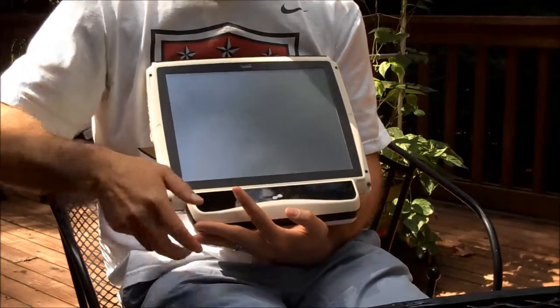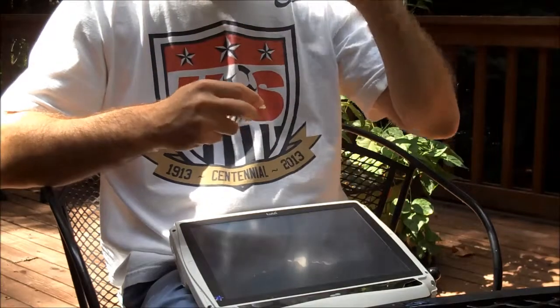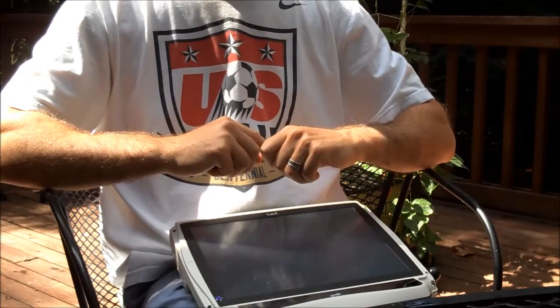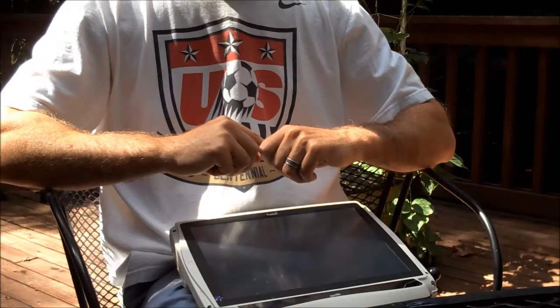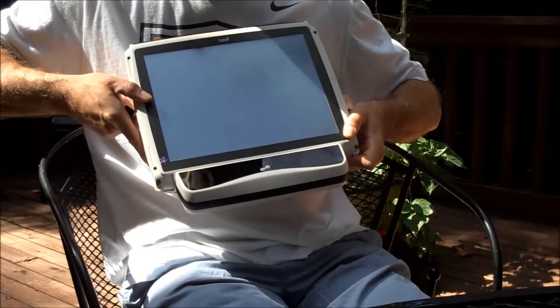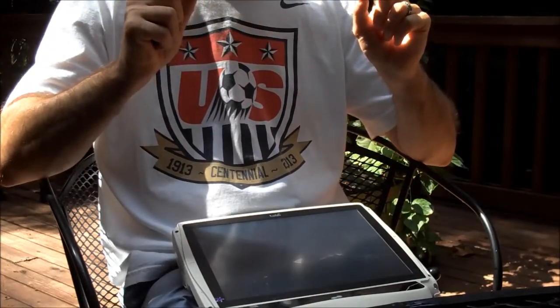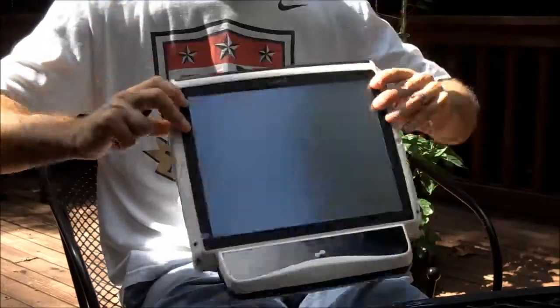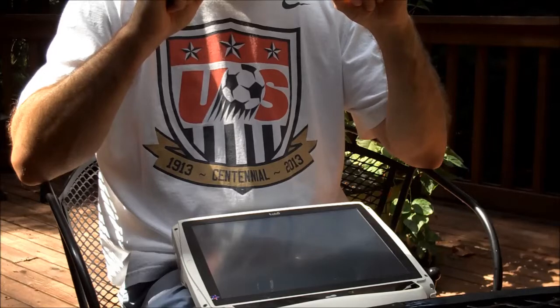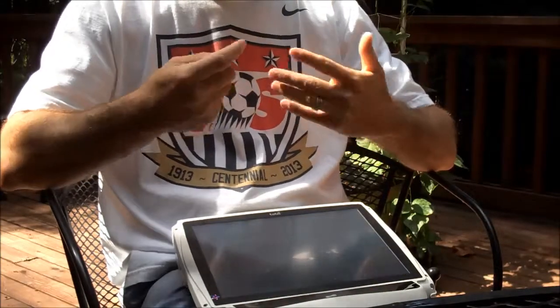SkyDrive and Dropbox, and there are other cloud storage services out there, are designed around being able to store files out in the cloud on the internet and access them from any machine. The nice thing I like about SkyDrive and Dropbox is they both have client applications for Windows that you can store locally, and the Tobii device is basically a Windows computer. It's running the Microsoft Windows operating system, and I run Windows on my laptop. So I can install the client on both Jay's Tobii and my laptop, and that client for both SkyDrive and Dropbox will synchronize a local folder with what is out on the internet automatically, as long as you have internet access.